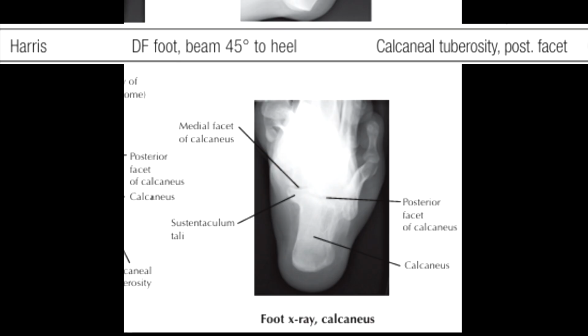Calcaneal fractures, especially intra-articular ones, are best appreciated on this view, where the subtalar joint surfaces can be analyzed. Any loss of congruence or irregularity here carries major clinical significance, as subtalar arthritis is a common long-term consequence of missed or inadequately treated calcaneal fractures.